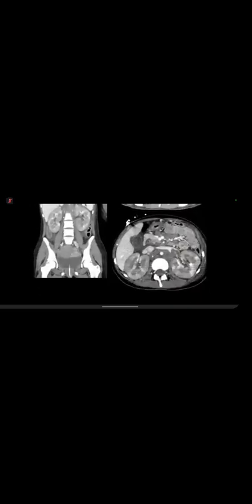And inform the findings to the referring clinician and inform the pediatric colleague and do a biopsy for further evaluation. Okay. They also have filling defects here. I'll just zoom it for you. In the pulmonary emboli, and you can see filling defects inside the renal vessels as well.